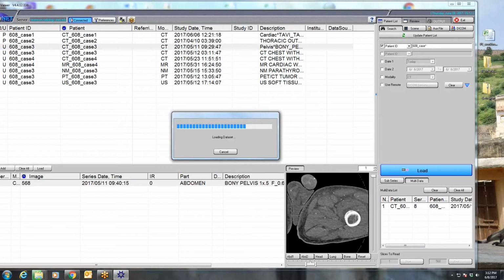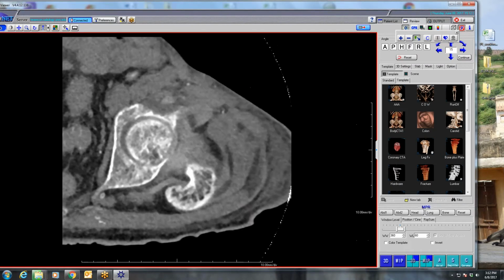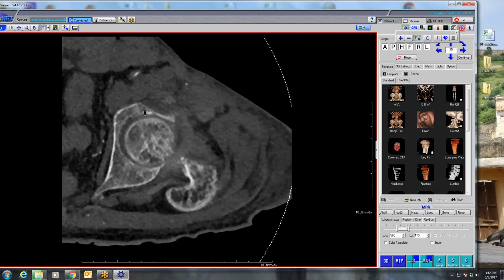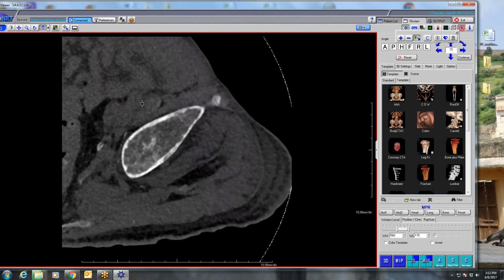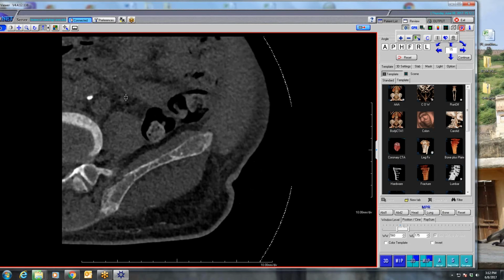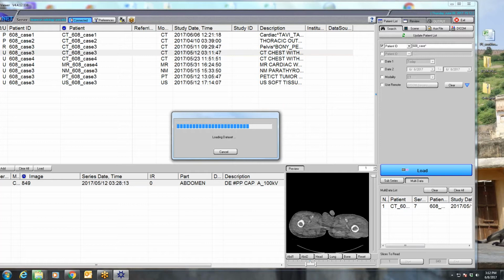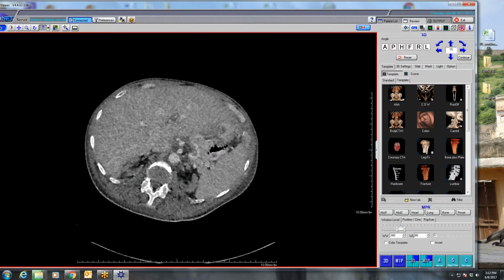This is a cool case where I went down the wrong tubes just from lack of history, which none of us had. This is a youngish guy, never been diagnosed with anything, who came in with a pathologic fracture of both femoral necks. You can see he's never been to a hospital. He's never been treated with anything. You can see his bones are not normal in any way. They got a chest CT, and the only history I had was pathologic femoral fractures.